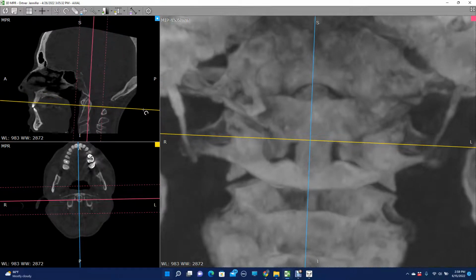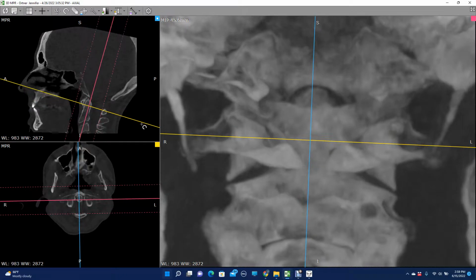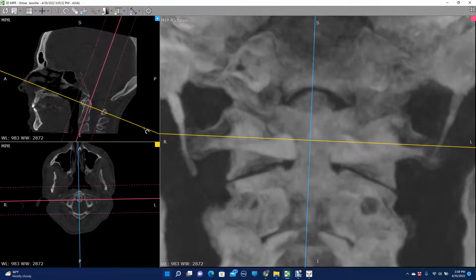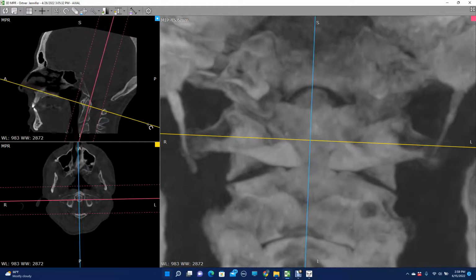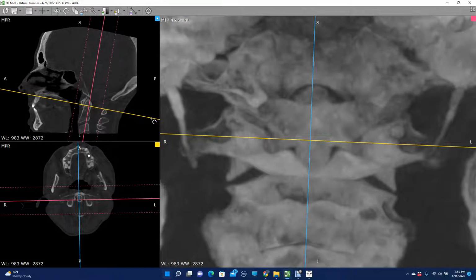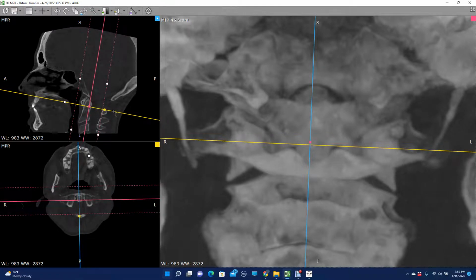And the method I prefer is not to necessarily look at this and measure it down the plane line, but measure it where I see that C1, C2 joint most flat. And I actually feel like it's pretty much more there. It's usually you drop this plane line down about 10 to 15 degrees, and that is usually where I see that C2 joint flatten out. And that seems like a pretty good place to measure.